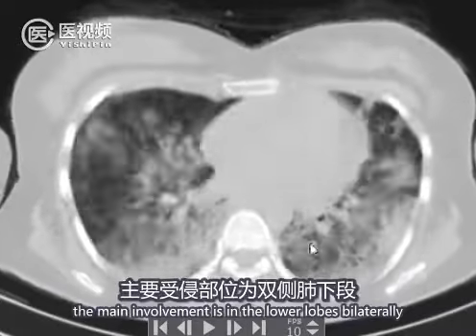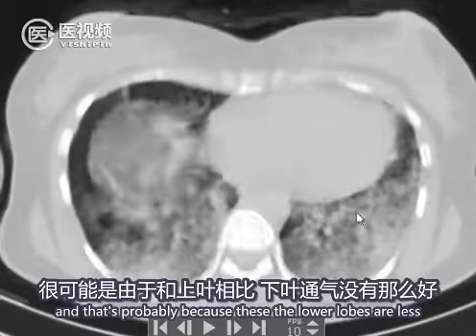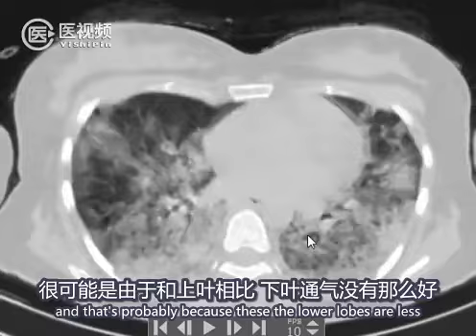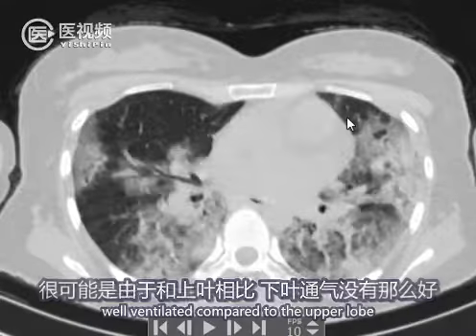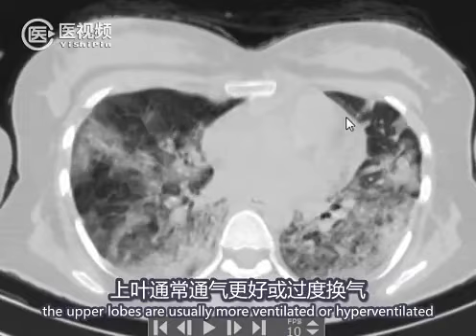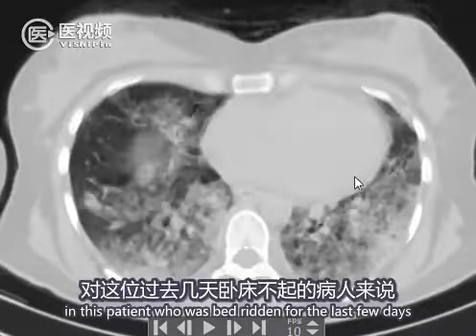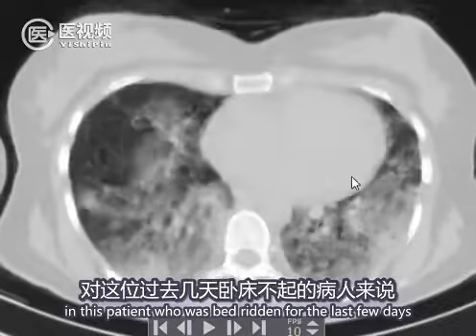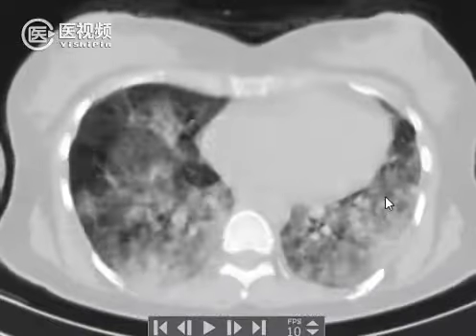The main involvement is in the lower lobes bilaterally, and that's probably because the lower lobes are less well ventilated compared to the upper lobes. The upper lobes are usually more ventilated or hyperventilated in this patient who has been bedridden for the last few days.